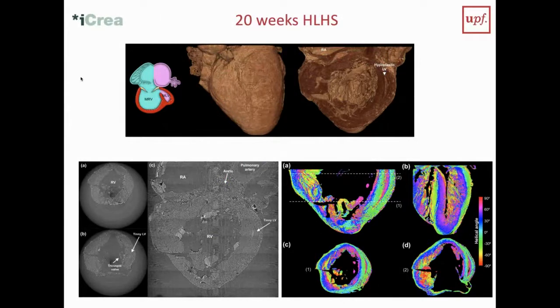Here is another example. This is a fetus that had a single ventricle, so instead of two ventricles, just one. What looked like one ventricle to the pathologist actually has a very slit-like, very small left ventricle still available. And you can nicely see this in the fiber orientation, where you have this double change locally in what looks like one wall. So again, in principle, this is reasonably okay.